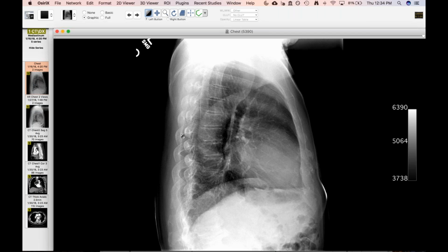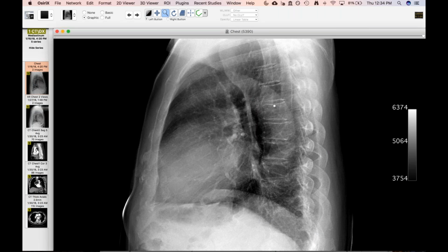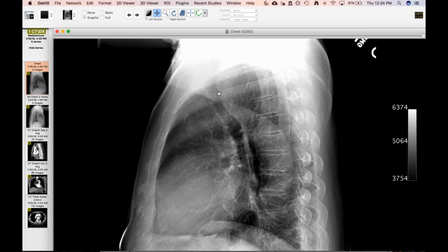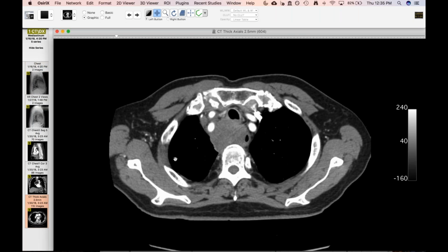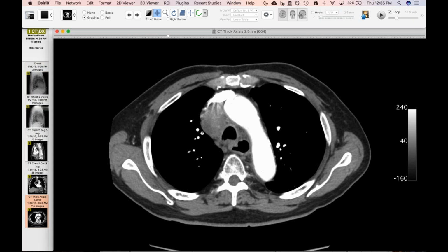And when you look on the lateral view, you can clearly see that this is not just the run-of-the-mill tortuous vessels, because look at what it's doing to the trachea on the lateral view. This is a nice obliteration of the retrotracheal space, or Raider's triangle here, with the trachea being bowed anteriorly. In this patient, this was done at an outside hospital, and I think this had not been picked up. The patient was having chest pain and dysphagia, eventually underwent a CT, and you can see accounting for that. And it's amazing that he had all of this right paratracheal lymphadenopathy.